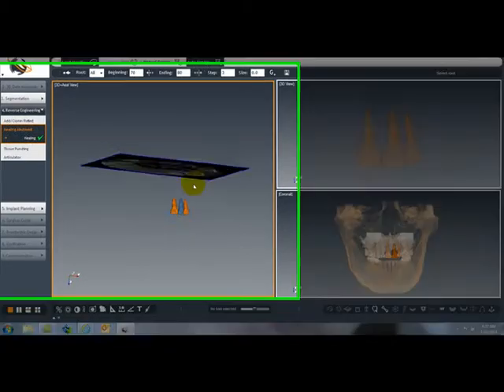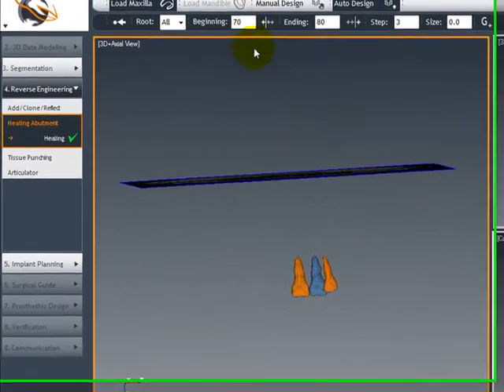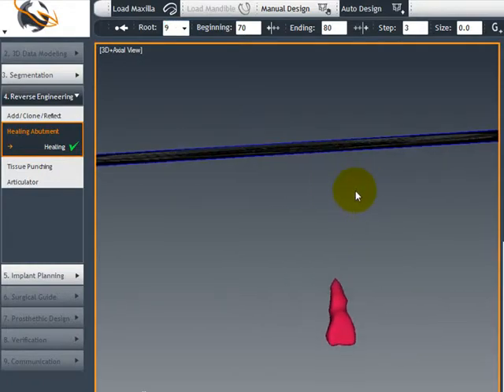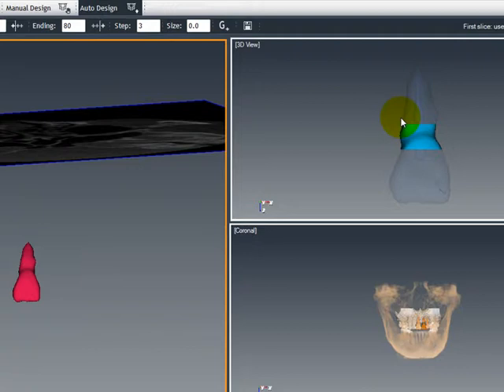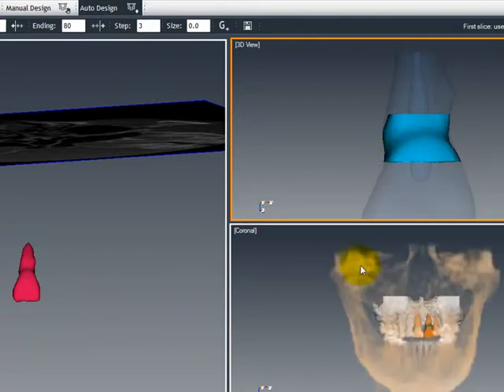So now we can take the tooth in question, select tooth number 9, and mirror image that root shape. Here we have identified the beginning and the final step that we can scan, and we can replicate nature. Notice this is the emergence profile of that tooth. This is the position of the implant right here. This is the area where the papilla is going to be protecting the mesial and distal area of it.